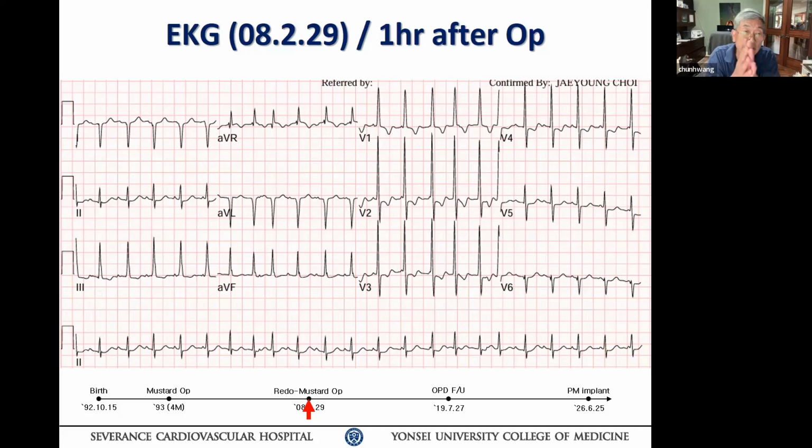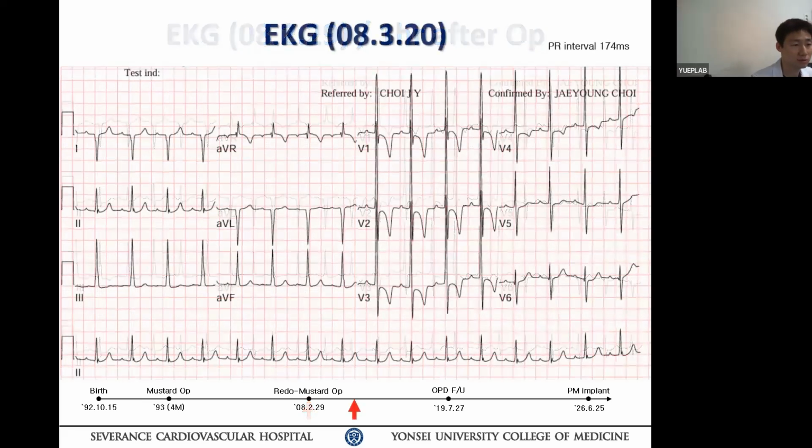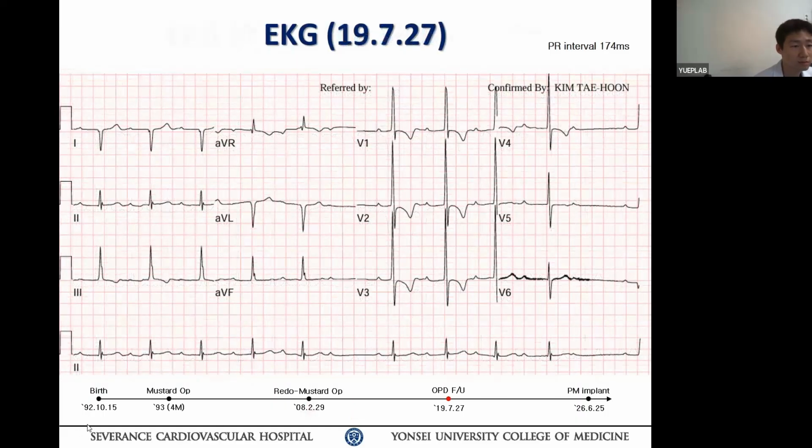Yeah, this is a case. That's why I thought it very unusual to have right ventricular hypertrophy and such a small P wave. This is a very unusual thing to see. Let's see the next ECG. The next one, yeah, this ECG.